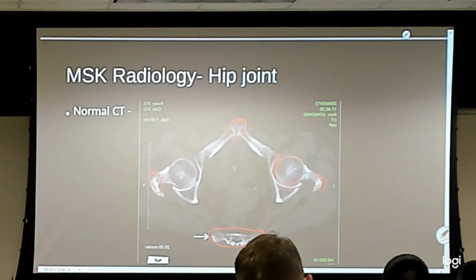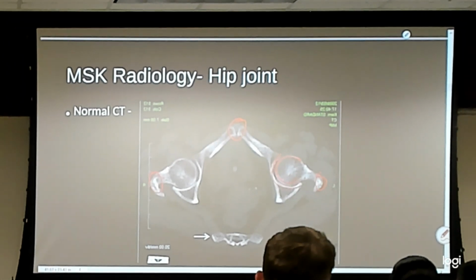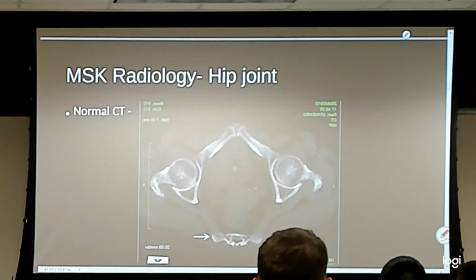There's a positive arrow sign on that. If you overanalyze that, there is a little line right at the tip of that arrow. Not sure if that's a sacral fracture. I try not to overanalyze it, but if you think you're seeing things, maybe you are, because there's an arrow sign. I picked this one because of the rest of the picture, not necessarily that.